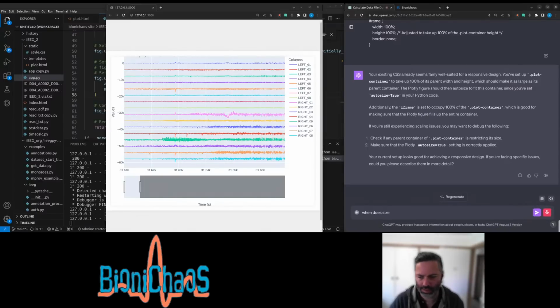Window sizing still not great, especially when loading the page the first time. The window size is different compared to when you move the slider. Also, there is some text above the chart that is not shown correctly, seems hidden. Also, can we remove the background from the chart itself.